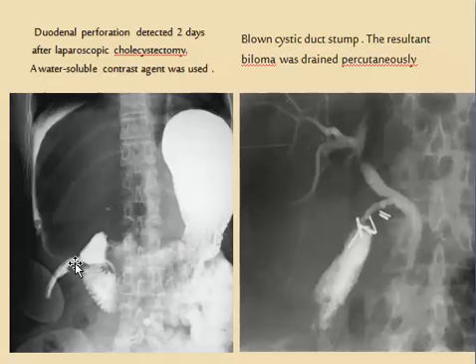Here is extravasated contrast after laparoscopic cholecystectomy. Water soluble contrast was used. This is not barium, and there is definite perforation of the duodenum.